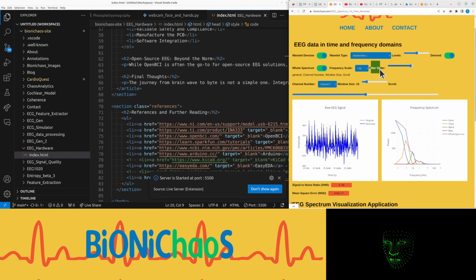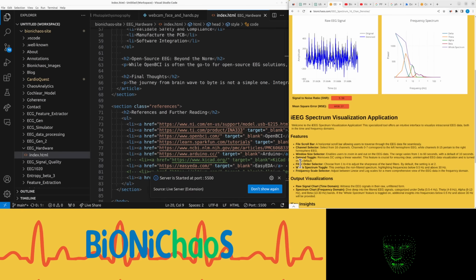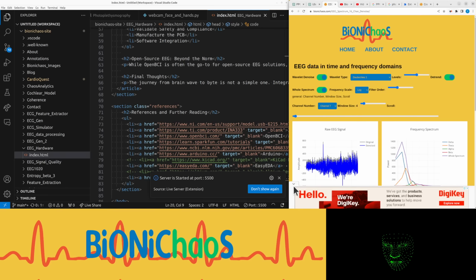Yeah, this needs to be made clear that the filter order is only affecting the frequency domain. Should we do it now? There's a description, so the filter order selector, choose from 1 to 4, adjust the sharpness of the band filter. The default setting is at 2, and, oh, that looks correct. This thing would not actually show you the value, like the window size there. That little value there will actually change.